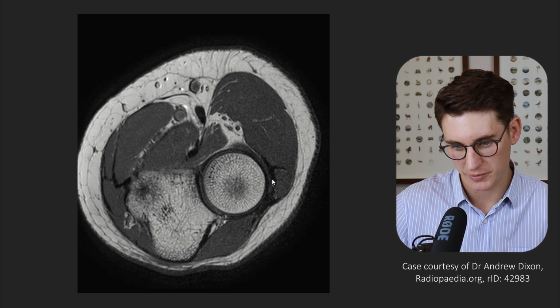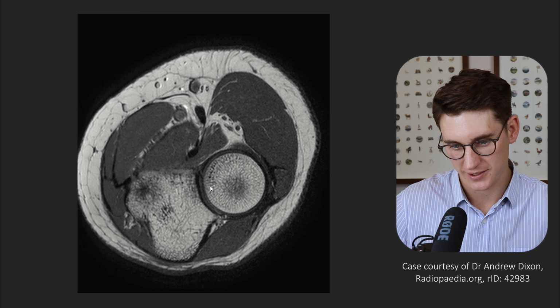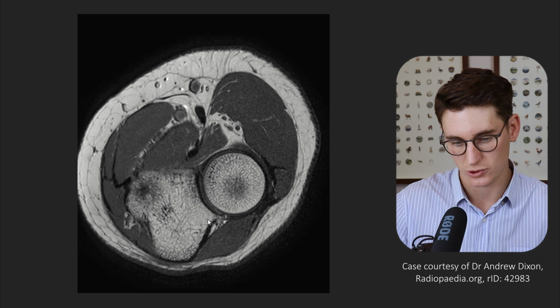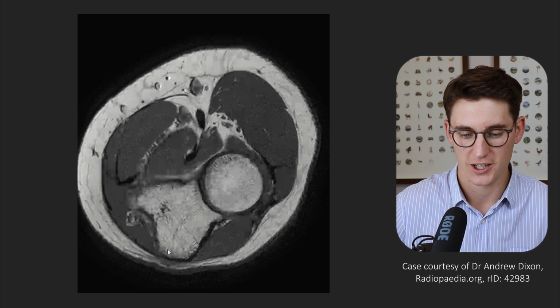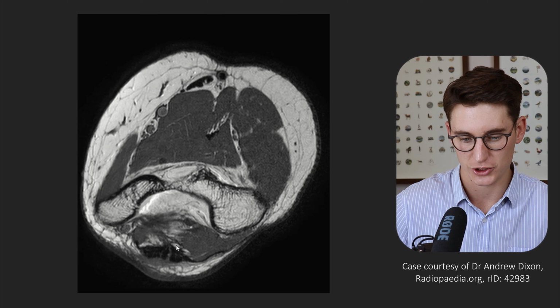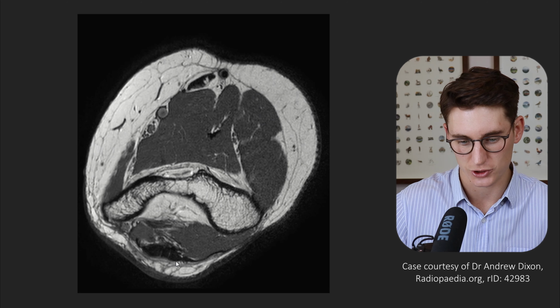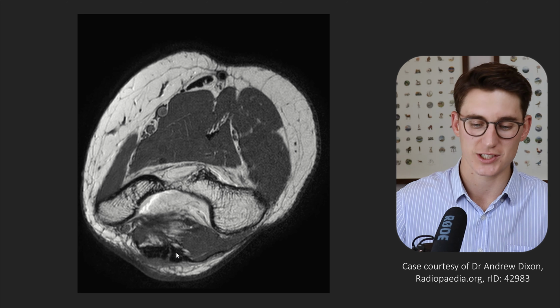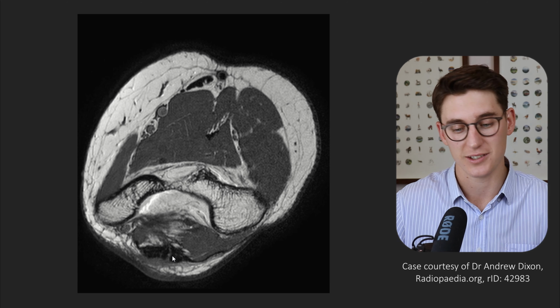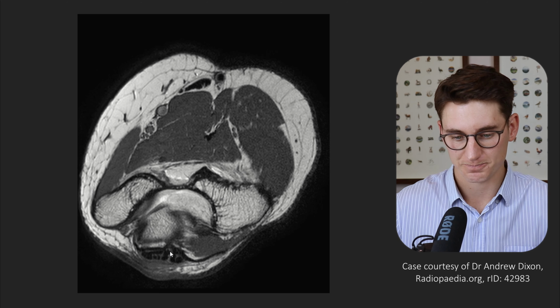Look at this annular ligament heading all the way around the radial head there, this dark structure here, from our volar sigmoid crest heading all the way around to our dorsal sigmoid crest of the ulnar bone. We can see the olecranon here of the ulnar posteriorly, and as we head up, we should see this triceps tendon, both the muscular and the tendinous portion. You can see the heterogeneous signal in this tendinous portion of our triceps tendon, and that's normal for the tricep.